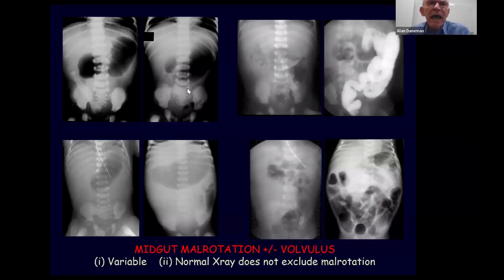But that's not the case, because sometimes the duodenum in these babies is either collapsed or full of fluid. And when it's full of fluid, you may only see the gas in the stomach, and you may simulate a gastric atresia or a pyloric stenosis with partial obstruction because there's some gas over here. So you have to be very careful in patients that are vomiting bile.